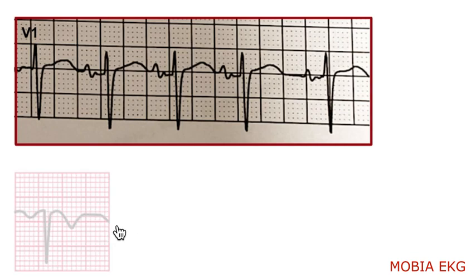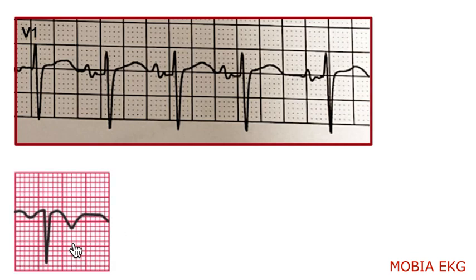If you look at this cycle at the beginning, it will be very difficult to have a correct interpretation unless you notice the recording electrode is in lead AVR. But if I tell you this cycle was recorded by lead 1, I'm sure you will report an abnormal finding.